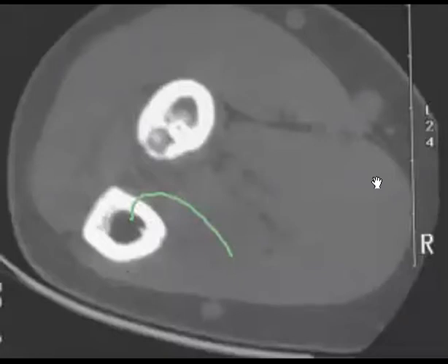We mentioned before that radiofrequency ablation will be the treatment. Nice. So this is the nidus, with central lucency here, and relieved by salicylates. This is in the history of this patient. Okay, nice one.